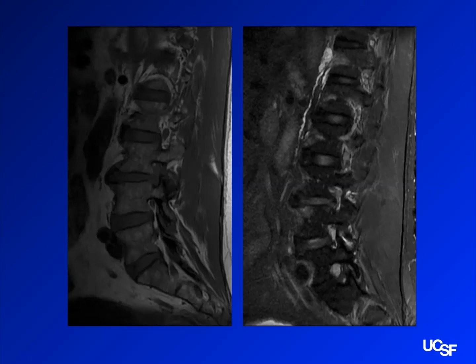So here's just some additional images. This is just further lateral. These are offset a little bit for some reason. This disc corresponds to this. But what do you see going on here? So you're lateral, you're out at the left, at the level of the neural foramen, and what do you see?